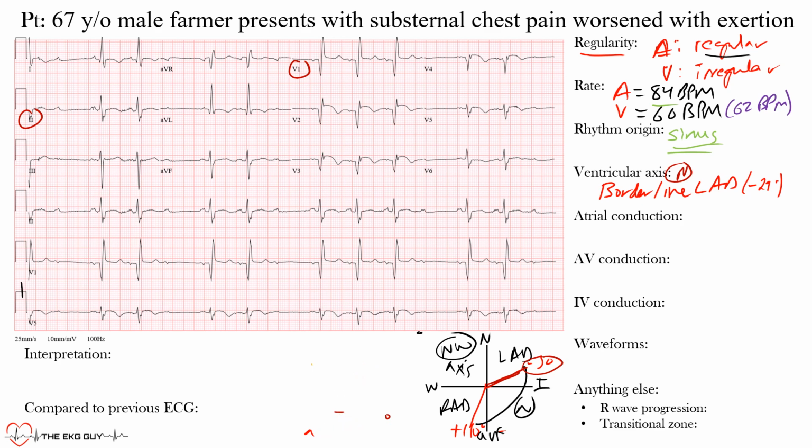So with our P waves, okay, we're looking at these rhythms, and remember that the beginning of the P wave represents right atrial depolarization, and the terminal portion represents left atrial depolarization, okay? And what we do notice here, we won't get into all the details, but there is evidence of left atrial depolarization, okay? So in V1, you can see these biphasic P waves. The beginning of it represents the right atrium depolarizing, and this is the left atrium depolarizing. When we look for left atrial enlargement, we look at this portion. When we're looking for right atrial enlargement, we look at the beginning, okay?